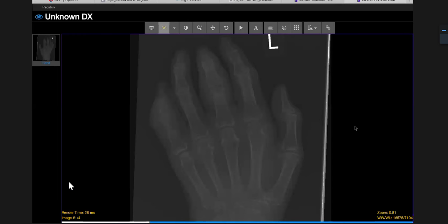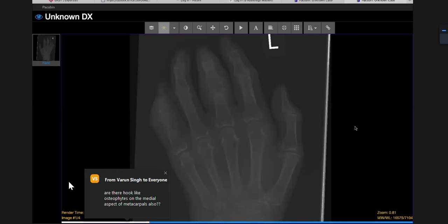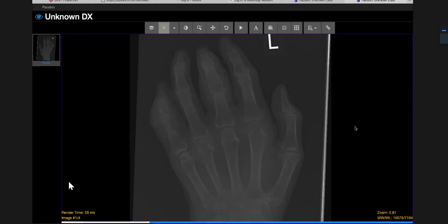They're erosions, aren't they, in gout? Yes. As with any condition in radiology, there are buzzwords associated which are synonymous with the diagnosis. With gout, it would be juxta-articular, punched out erosions with sclerotic edges. And then the soft tissue swelling you're seeing, what is that if they've got gout? It's the tophi, and that's typically dense swelling of the soft tissues, which is exactly what this is.